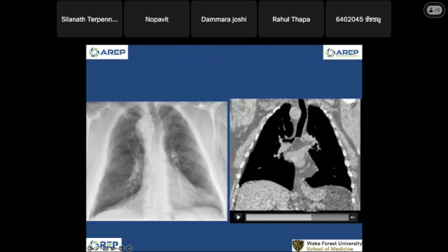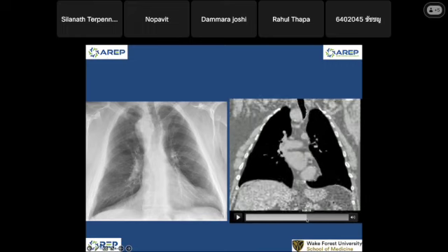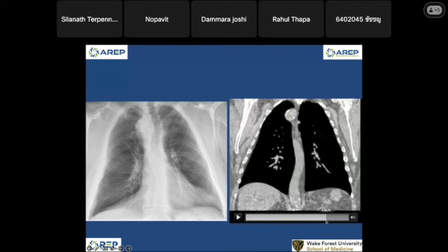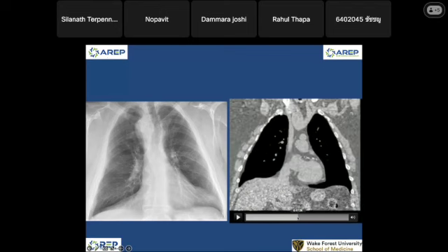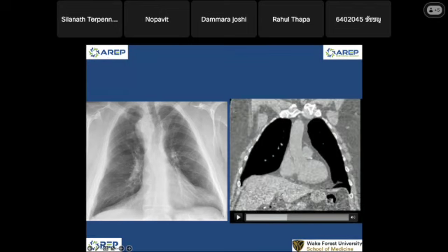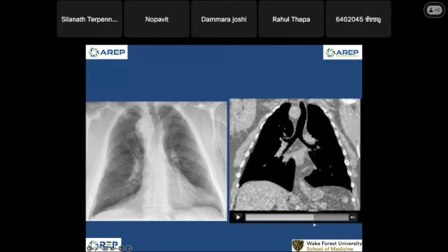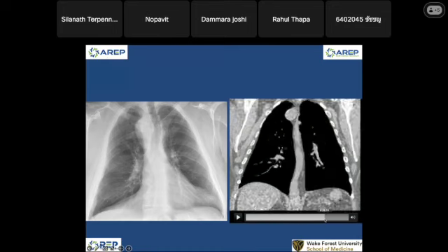Look at the trachea. This is my trachea. It's shifting, actually. Look at this. This is shifting too. Why is it shifting? Does this look normal to you? Okay, this is my aorta. We just follow it up. And then the aorta is right here.